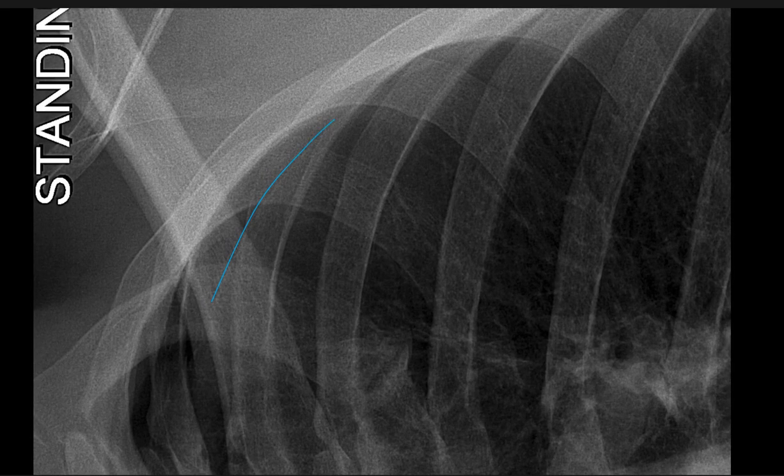There it is. All right, now here's the last thing that I want to discuss. There's a lot of stuff going on there, right? There's a lot of lines. We got a lot of ribs. We talked previously, very early in one of our talks about anatomy, about the scapula, and also about this thing called a companion shadow, and I'm going to review that briefly towards the end of this talk.